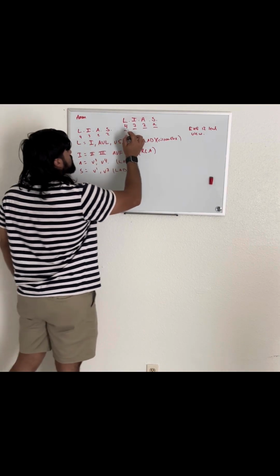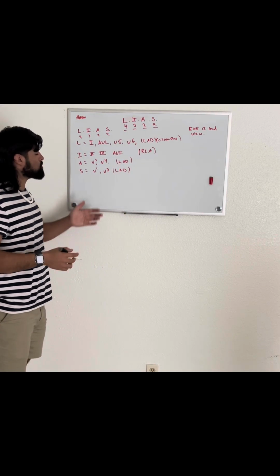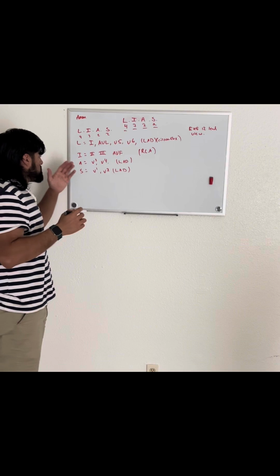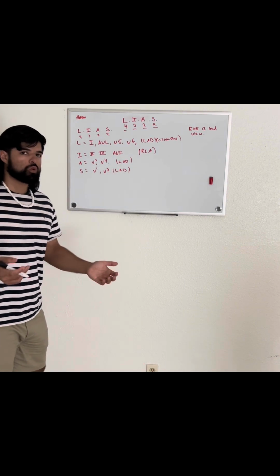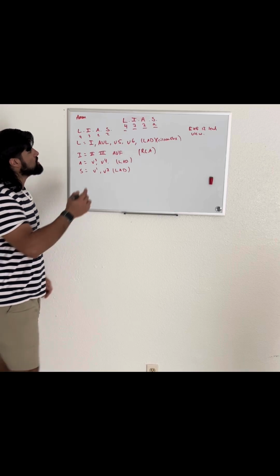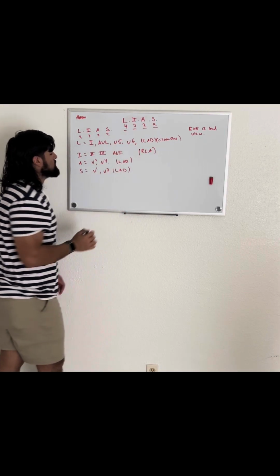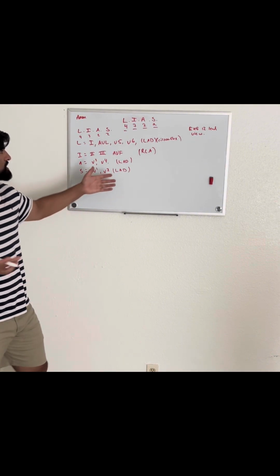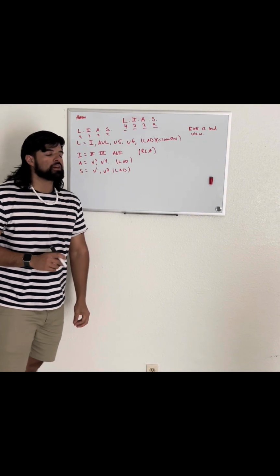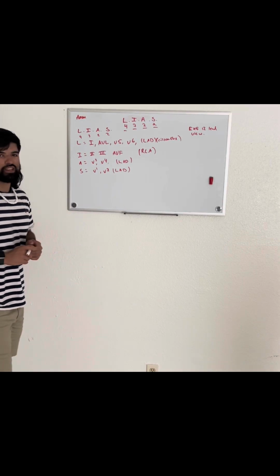So we went 4, 3, now we're going to 2, which is the anterior portion, and that's going to be V3 and V4, and that's going to be the left anterior descending coronary artery. And then we go to the last, septal, which has 2 leads, V1 and V2. That's also going to be the left anterior descending, of the 12 lead, right?